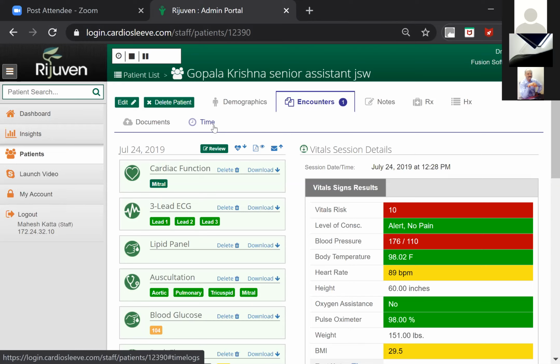In terms of migration, what do you mean there? Do you have similar records you would like to start with, or do you want to use it as an entirely fresh system? I think we have some cloud here.